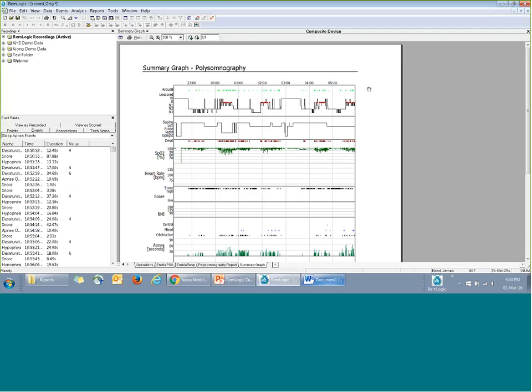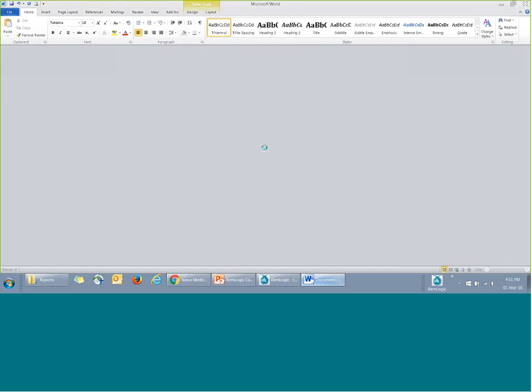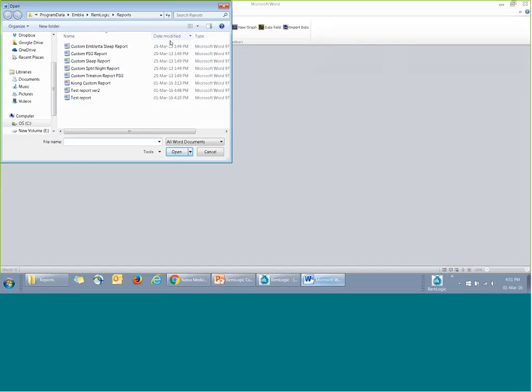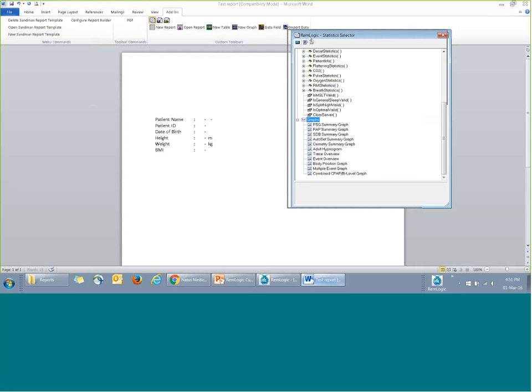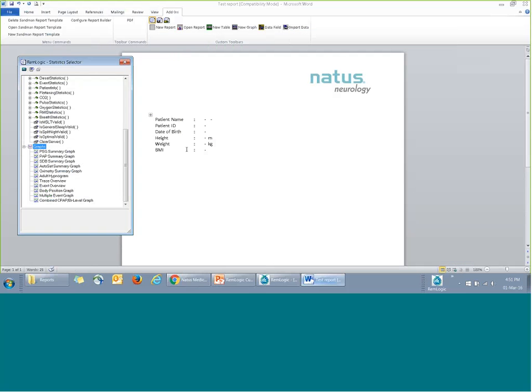Okay, I'm going to show another example with the calculator. Okay, so I will discard this one. I will just open, okay, this is the one that's working. Okay, so let's look at the functions of the calculator. So what else can we do with the calculator?